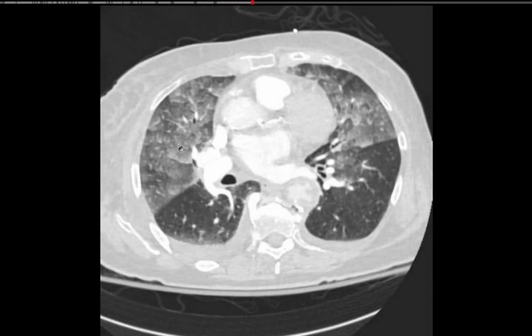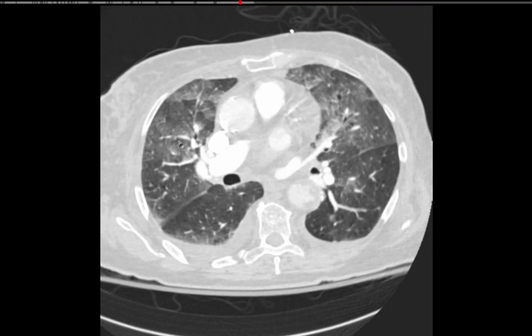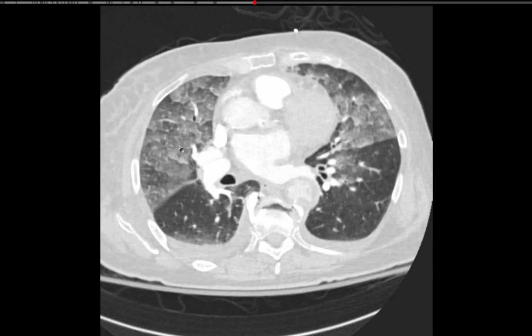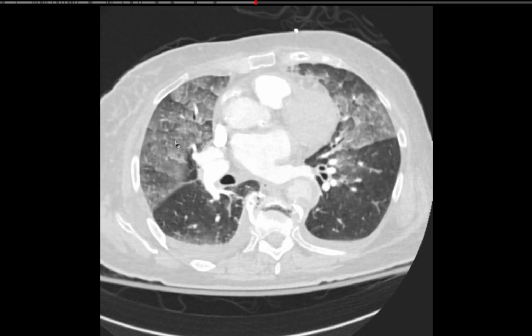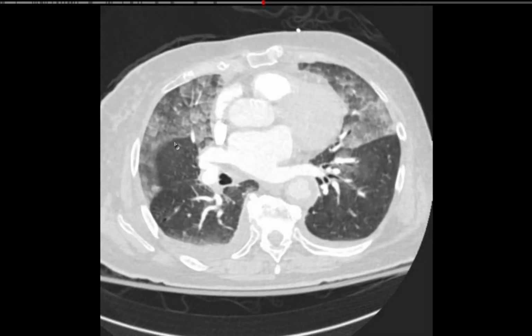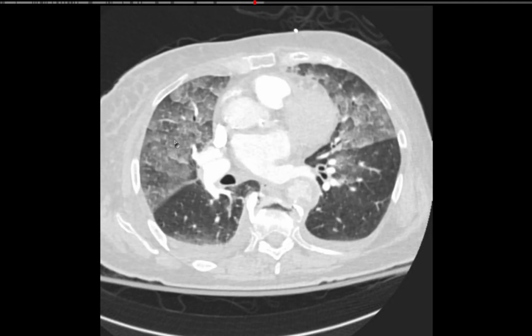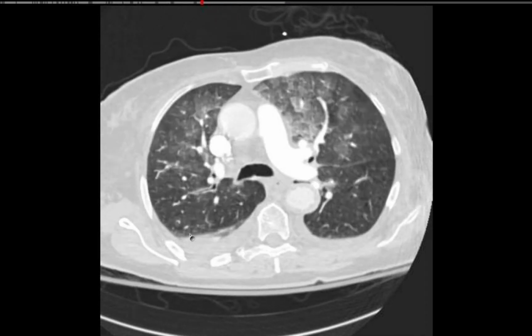What do you think? I agree, and I think Travis earlier had shown a case and shared a paper where it was described as like the karst, K-A-R-S-T, mountain. Yeah, mountains, and I think it was Chinese art. Yeah, exactly. It's interesting. So why do you think the edema is primarily in the anterior lungs as opposed to the... I don't know. That is interesting. I mean, this pleural fluid. I don't know why it is.